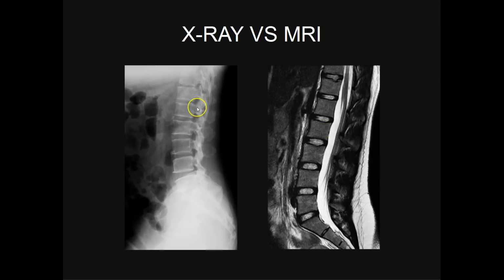But the main thing really with these two is just to see the difference between the two and why you'd want to go down the route of having an MRI if you've got chronic back pain, to see the state that the discs are in, and see what's going on in there in a bit more detail, certainly a lot more detail than what you get from an X-ray.